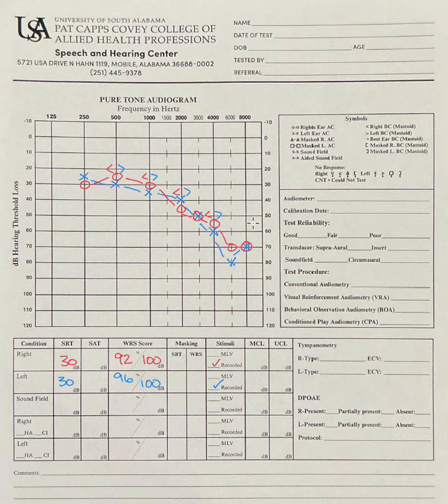So we're seeing a fair amount of hearing loss and in both ears. Those red circles are your right ear. The blue X's are your left ear, and here we're seeing that it's pretty much the same in both ears, which is good. Our ears go everywhere with us, so we ideally want the hearing to be the same. You just have a lot of hearing loss in both ears.